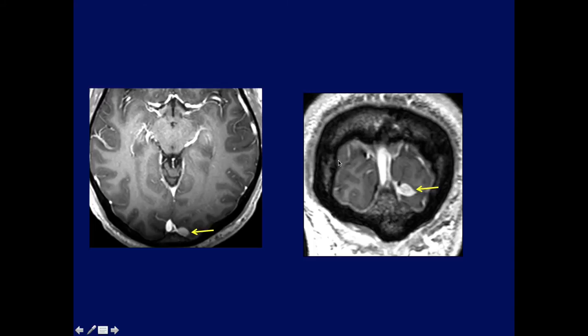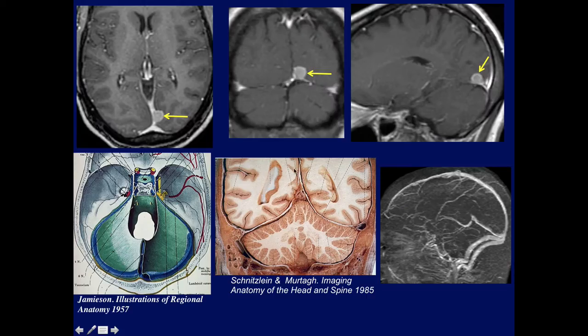And now we'll move towards the region of the torcular. Torcular meningiomas are quite rare, and this was my attempt to find one. This was incidentally just adjacent to the torcular, but not really a true torcular lesion. Here's another one actually close to the torcular, but arising from the straight sinus. Did not really cause anything.